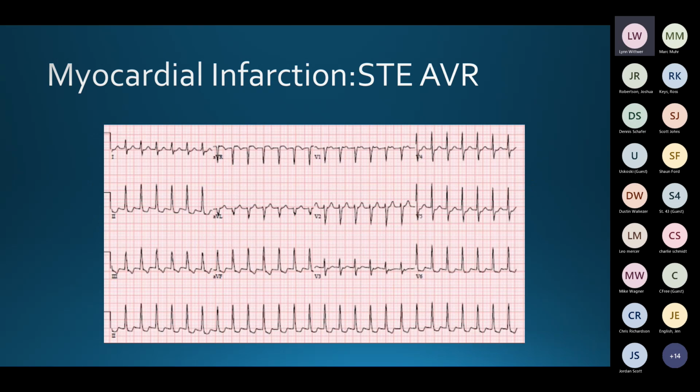This was one that I did find from our records that we did bring in, and it was picked up in the field as ST elevation in AVR only, but lots of reciprocal changes in the inferior and even in the lateral leads.